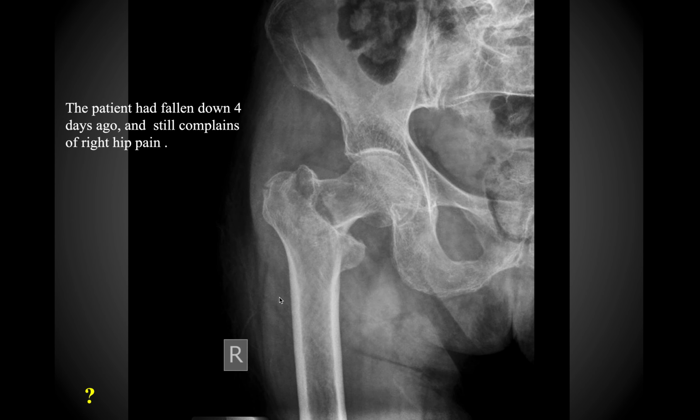Here's another example of a significant abnormality. In this case, if you follow the Shenton line, you'll notice that it's not that nice, smooth, continuous line like you would normally expect. You can see how the head of the femur and the neck of the femur sort of drop down from what you'd expect to be the normal position. So this person has experienced a fracture of the femoral neck.